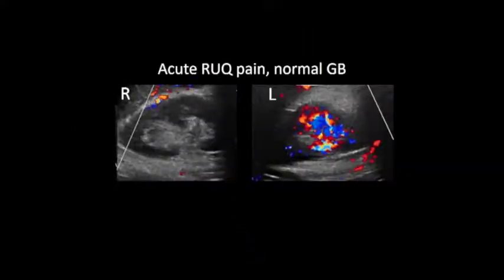This was a really interesting case. This patient presented, the thing that they were complaining about the most was right upper quadrant pain. Very significant right upper quadrant pain. We did the ultrasound of the gallbladder, and it was stone cold normal. And I remember one of the GI fellows coming and saying, "This is impossible. This patient has severe pain. There's got to be something wrong." And we had, of course, looked at the kidney, a few images, but we went back again and did turn on color.